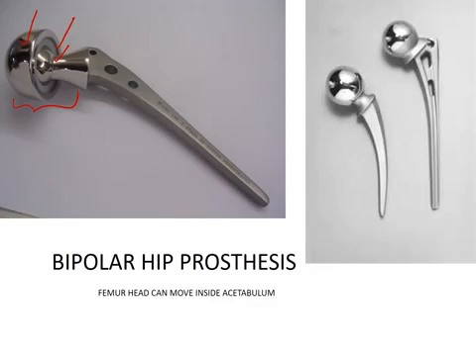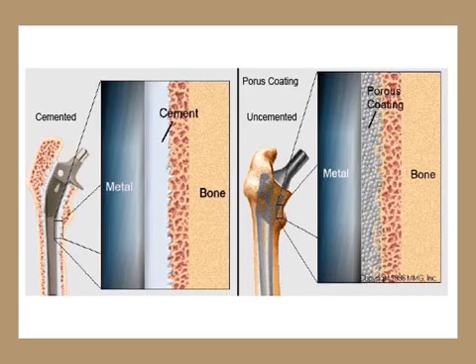You can also control the sizes of the implants in modular bipolar. Nowadays, when we do hemiarthroplasty, we usually do modular bipolar. Modular because each one has a different ratio of head and the neck length and the sizes. So it allows a better stable joint to be applied and better length of the neck to be achieved for a good functional lever arm for abductors. Modular bipolar.